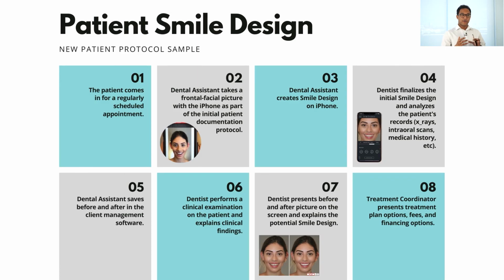When it comes to implementing the DSDApp in your daily workflow, we suggest that after the patient comes in and you do your initial consultation, you take a frontal facial picture of your patient, and then as you're listening to your patient, understanding your patient's wishes and desires, you can deliver a smile design.